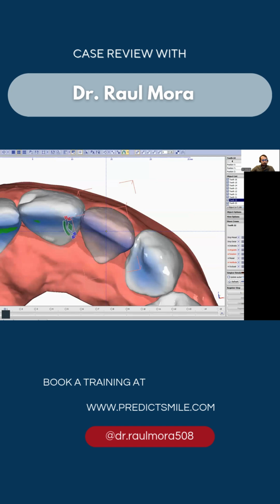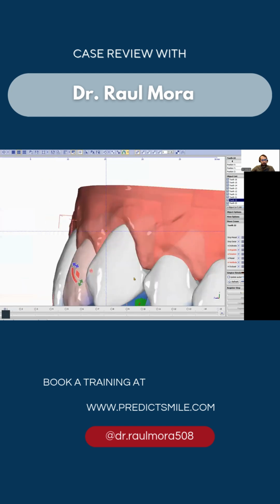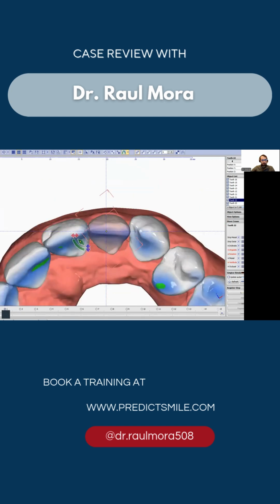Go to the staging panel and let me just fix the limitations. So now we have, oh, I didn't do the proclination, which was only 3 degrees, I think, something like that. So let me go back and make the pro-inclination as well, and the center of resistance back in the tooth.